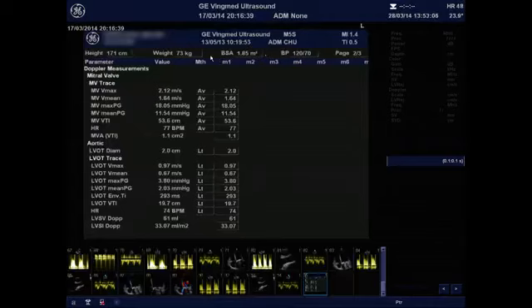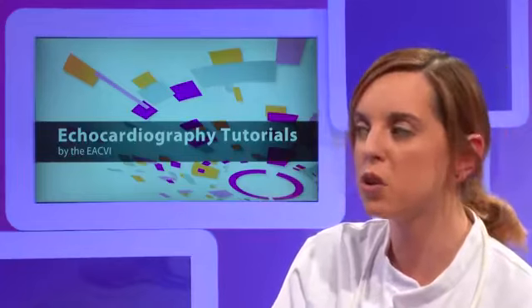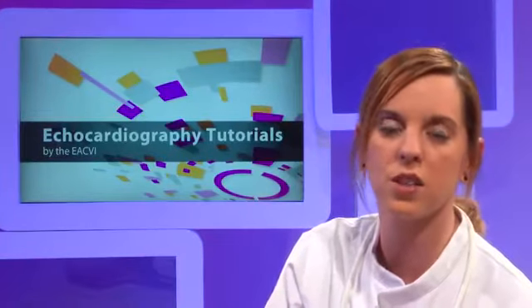For a mitral valve prosthesis, you have a severe prosthesis mismatch when the indexed effective valve area is under 0.9. And for an aortic valve prosthesis, you have a severe mismatch when the indexed effective valve area is under 0.65. Then, these are the three cases I wanted to present to illustrate the pathological features that you can obtain when you assess a mechanical prosthesis.